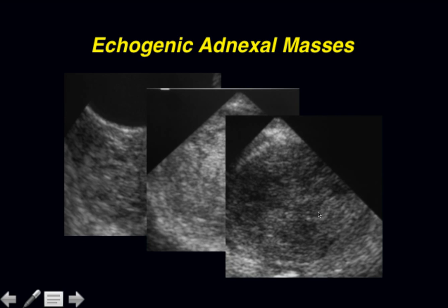These changes in the echogenicity of blood are typically related to the phase at which you are observing the blood after the bleeding event. Bright blood is usually reasonably fresh. Mid-gray is relatively fresh. Hypoechoic is older blood. So this woman gutted it out for a couple days before she came into the emergency room with her ectopic pregnancy.